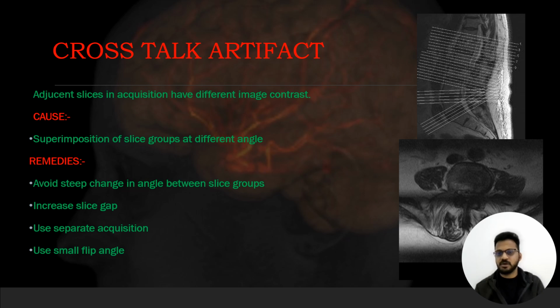Maybe some patients need more tilting. It will cause the crossing of the slices. If your images have this artifact, they will not be appropriate for diagnosis. So we can do a separate scan for that region, and we can also reduce the flip angle to reduce this artifact.